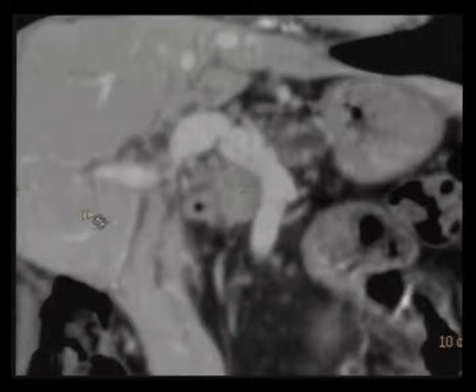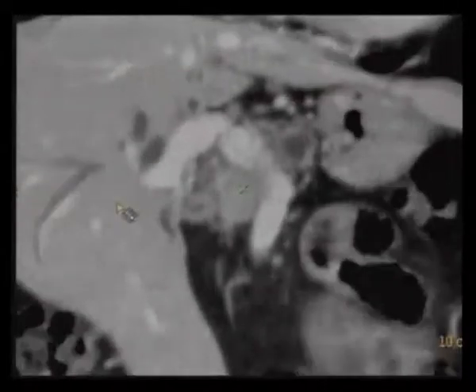If we go around the tumor and we rotate the tumor, we always see a thin fat plane. So the message in this case would be that this patient has no metastasis, has no carcinosis, has no enlarged lumboaortic nodes, and is a grade 0.